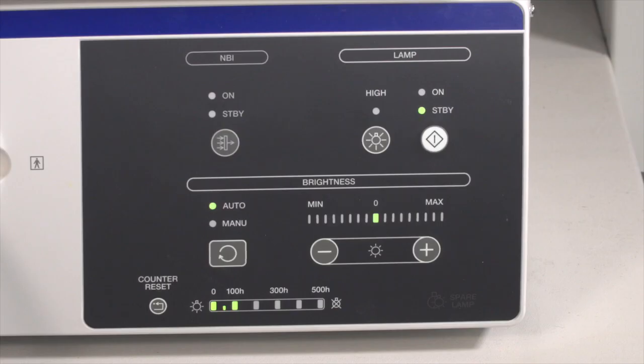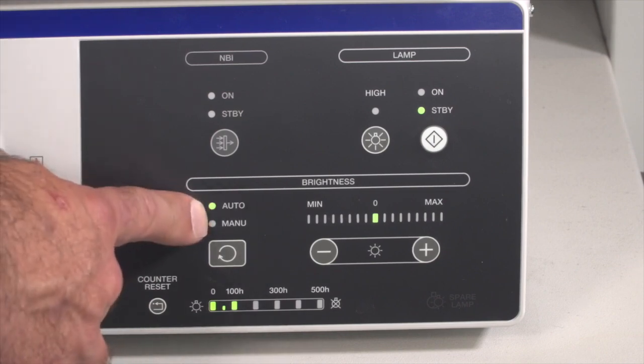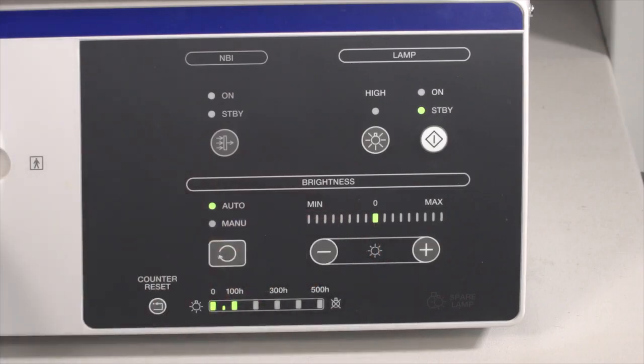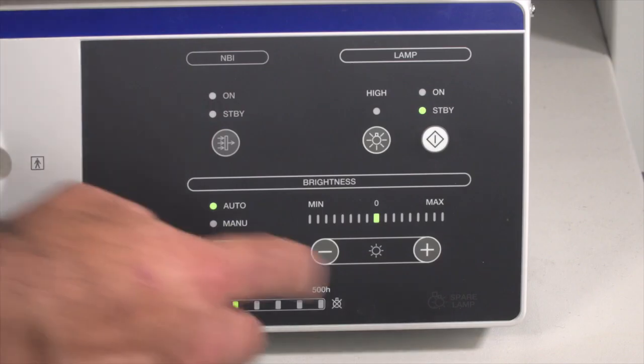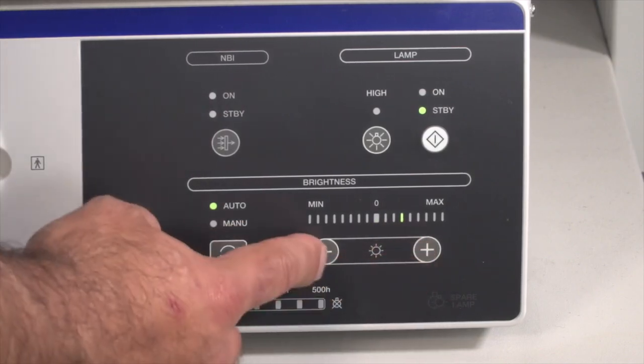In terms of adjusting the surgical light, it's recommended that the light source be set to auto with a baseline of around 0. If your light guides or telescopes are a bit old or you're in a very large or bloody cavity, you may want to increase your baseline of light delivery. You can increase your baseline light delivery by pressing the plus button and decrease by pressing the minus.